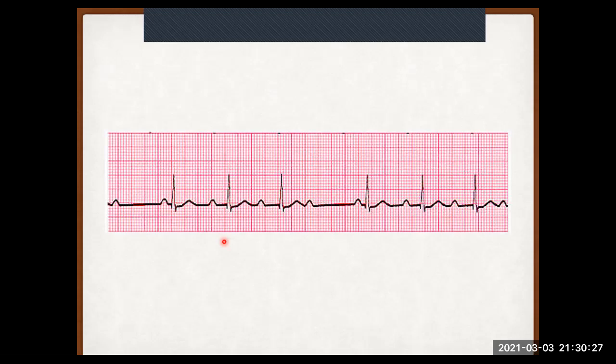Let's go through the rest of our criteria. Is our QRS complex narrow or wide? They are quite narrow. Does a QRS follow every P? No, it doesn't. You can see there are areas where there's no QRS complex. So it's abnormal, and so it must be irregular. By definition, it can never be regular because there are missing beats. Okay. So if you answered abnormal, very good.